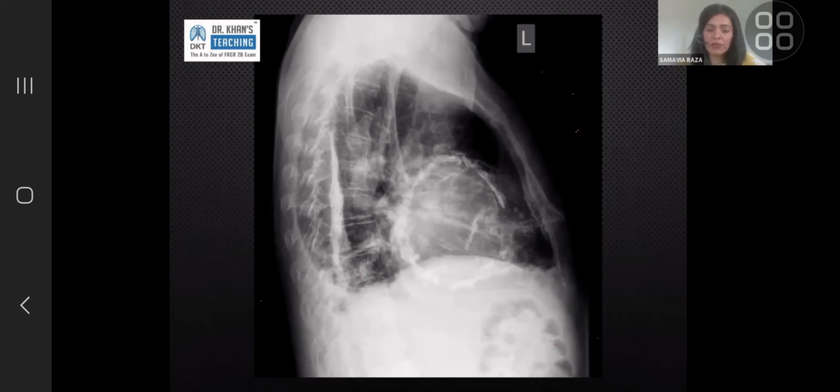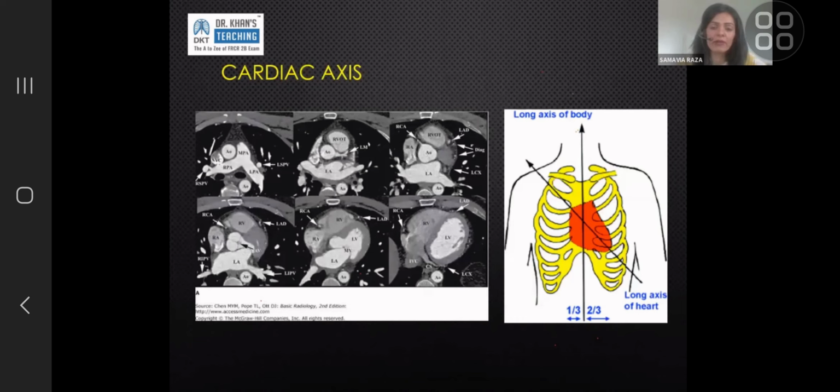So if you do notice almost circumferential, prominent, thickened, even nodular pericardial calcification, the patient would almost always have symptoms of constrictive pericarditis or constrictive heart disease. At that point, the patient would already be under follow-up with cardiac physicians. But it's really much easier, the more prominent it gets, the easier it is to pick up on plain film. On cross-sectional imaging, obviously, pericardial calcification is very easy to pick.